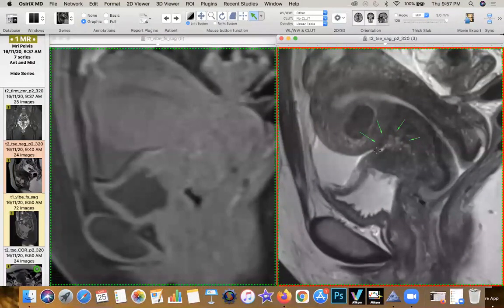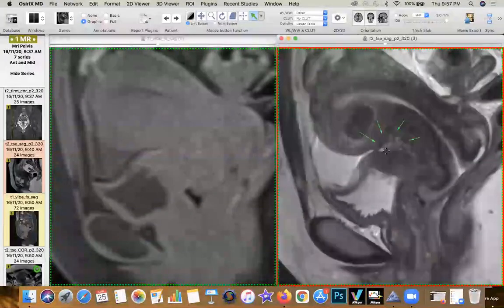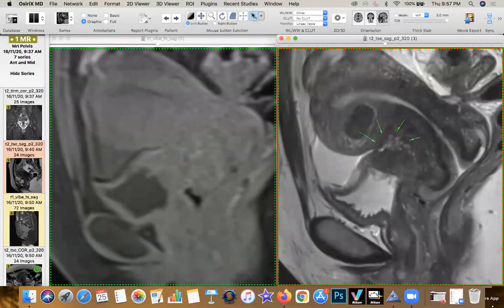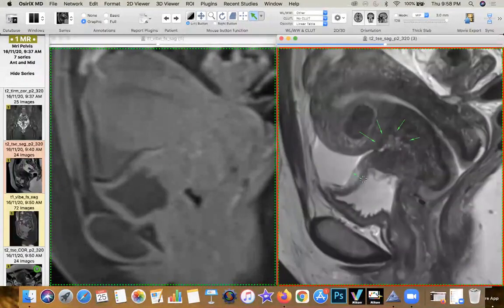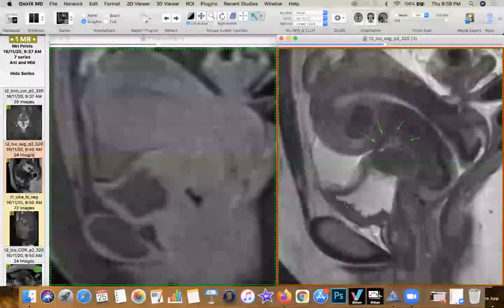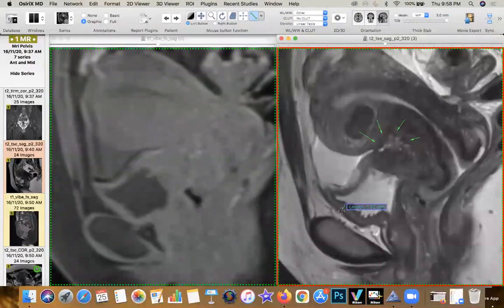You can see that the peritoneal reflection has now been tethered to the structure. And now you can see how this tissue has gone through and through and taken apart the posterior superior aspect of the bladder dome. Now here, this is normal thickness of the muscle. So you can appreciate the normal thickness of the muscle, which is seen here, of the bladder wall.